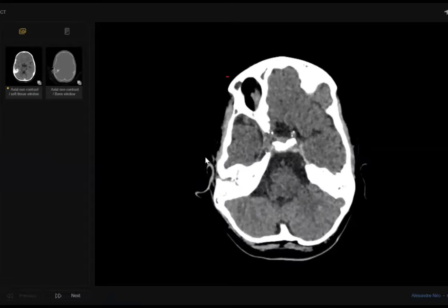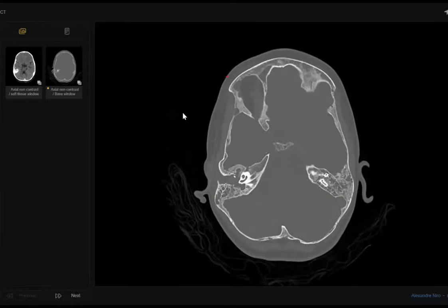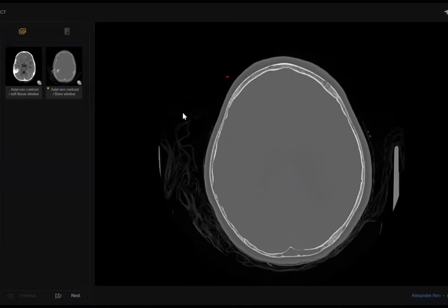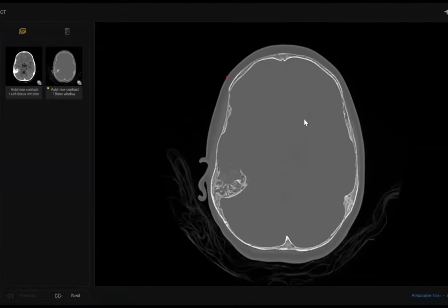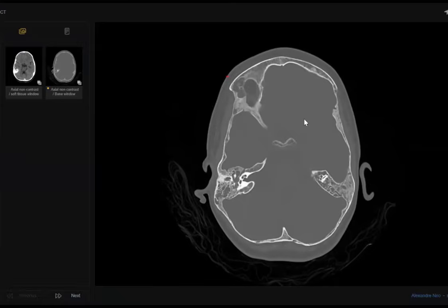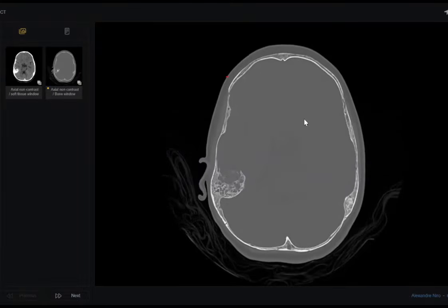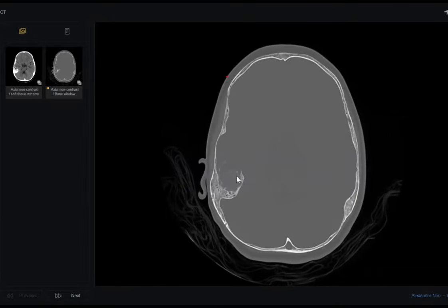Anyway, at least it is a polyostotic lesion. Okay, my colleagues, a polyostotic lesion. If we missed that there are multiple bony lesions, it will be a big mistake. If you told the examiner this is a lytic lesion, maybe Langerhans cell histiocytosis, maybe fibrous dysplasia, okay, but better to reach a proper diagnosis. Sorry, I'm confused because I prepared one fibrous dysplasia case today morning. It's okay.